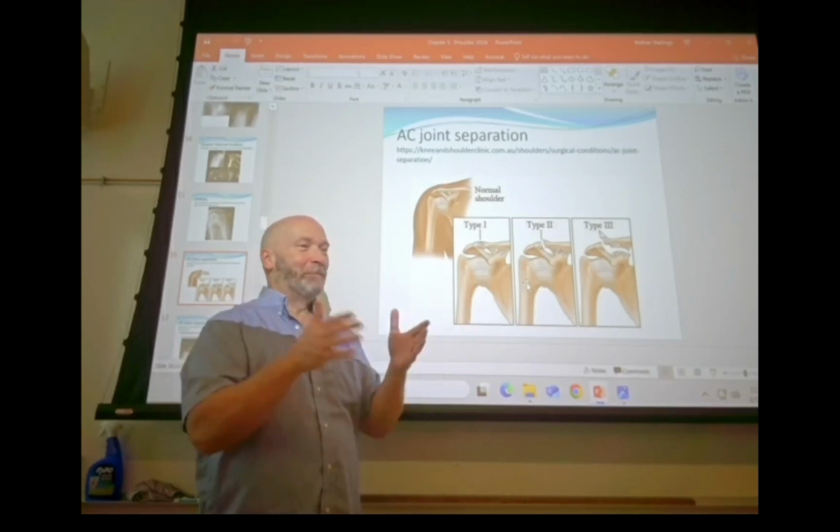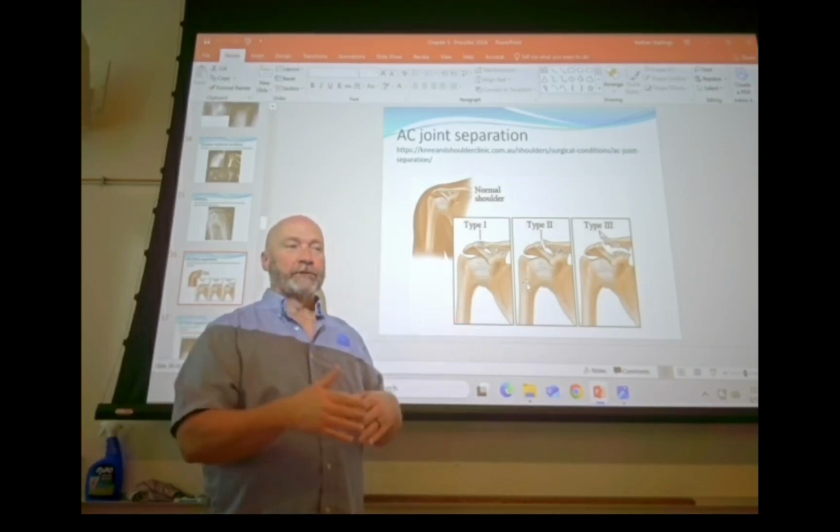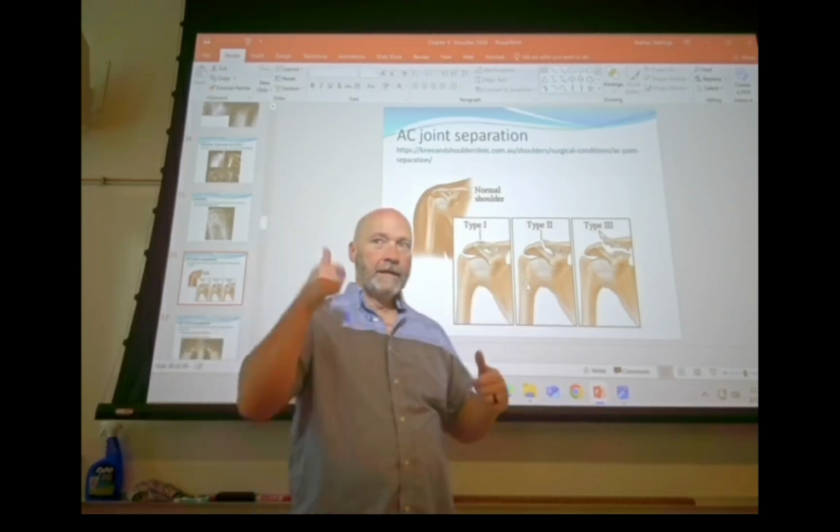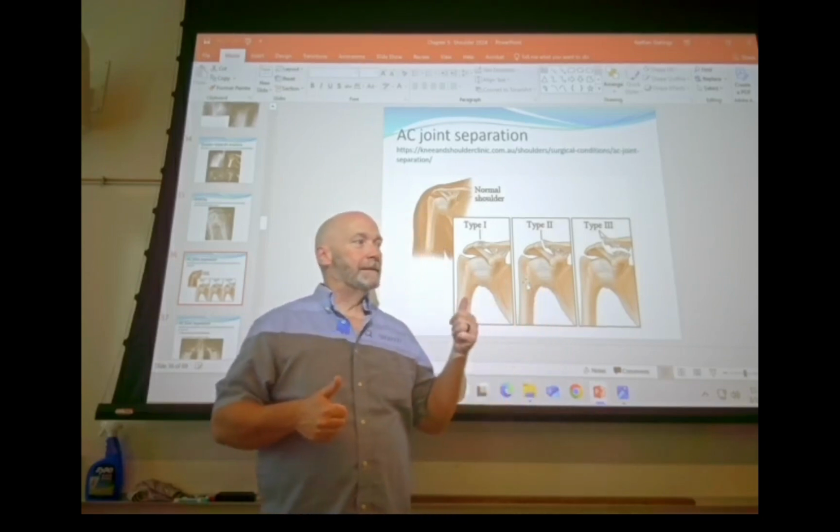So back up 72 inches, you're going to have less divergence of the central ray, more likely to get all that on the image receptor. Okay, so upright, with and without weights.